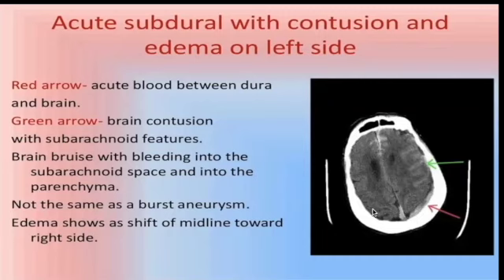Now, as you can see on the right hand side, you can visualize some of the sulci, but on the left hand side, you're not able to see the opposite ones. Okay, and remember, a subarachnoid hemorrhage is just bleeding in the space between the brain and its surrounding membrane, the subarachnoid space. So usually in the history of these patients, you will get a patient who says that they have some sort of sudden severe headache.